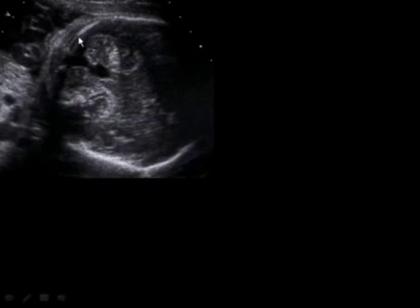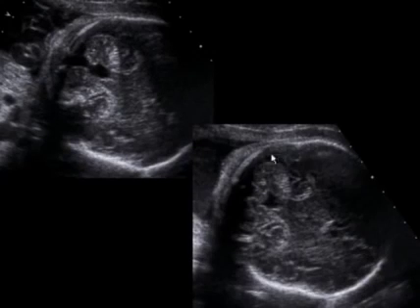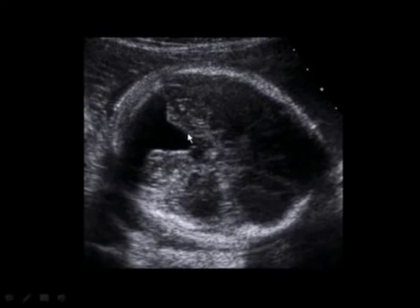And if the probe was tipped so that the calvarium is intact along the back of the posterior fossa, we see, as we do on this image here, that there is indeed a vermis and a distinct fourth ventricle, just in a different spot than was being imaged on the first image. Here's an example of a patient with the true Dandy-Walker variant. The fourth ventricle here is wide open into the cisterna magna, and the cerebellar hemispheres are flattened and distorted, particularly on the superior aspect of this patient with the true Dandy-Walker variant.